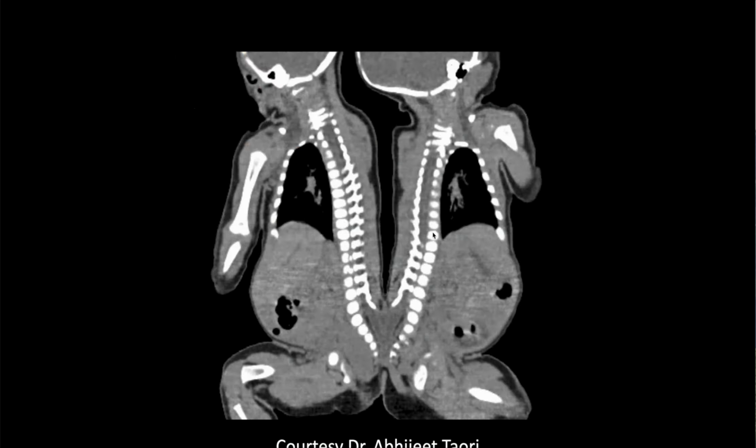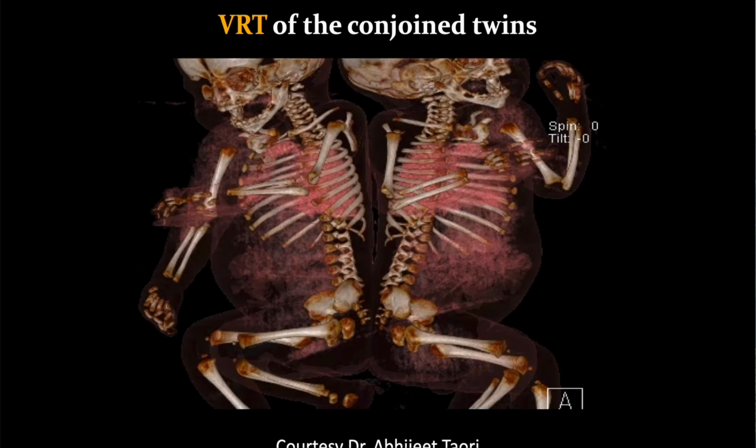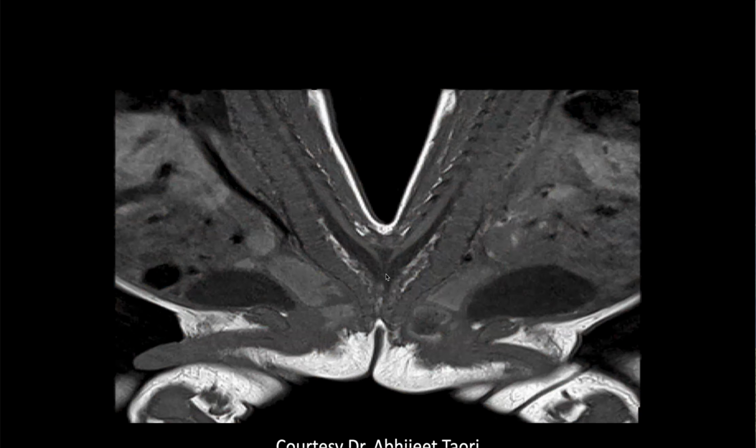And if we go to the reconstructed images here, you can see the sacral agenesis on both sides, and the fusion here of the soft tissues in the spina bifida. And then that's the 3D imaging. And then if we do an MR examination, what are you seeing here? Again, missing the posterior elements, and it looks like there's communication between the spinal canals at that level.